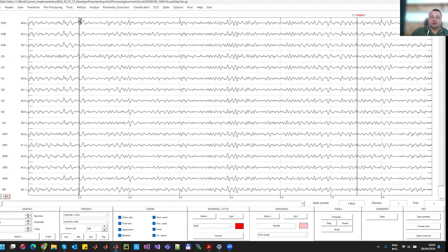A very important part for calculations for recoveriX and the CSP, basically, for motor imagery, is the electrode disposal on the scalp, because during the processing, we also have to perform different source derivations and so on. We have montages for every single product that we have. So in this case, we'll use the recoveriX montage that I will show you right now.